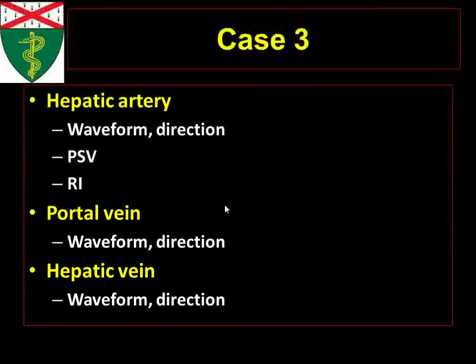So I like 0.5 to 0.8. Anything below 0.5 is not ideal. Anything above 0.8 is not ideal either. So 0.5 to 0.8 is good. What about velocities? 200. Perfect. Velocities no more than 200.